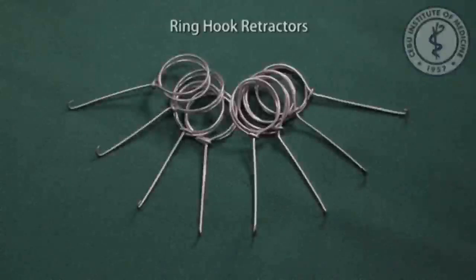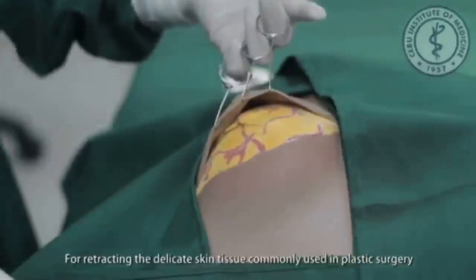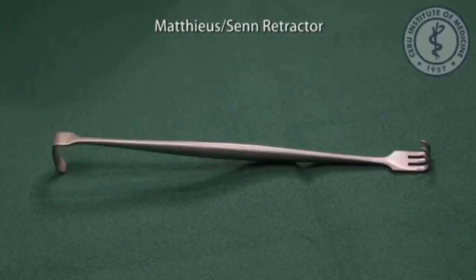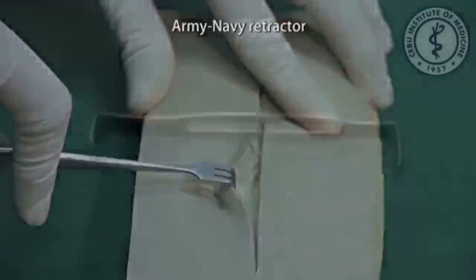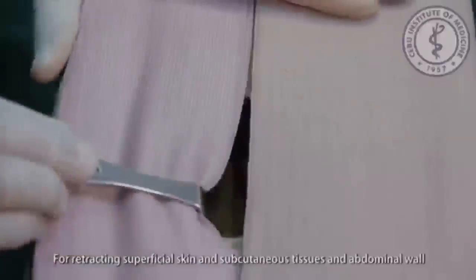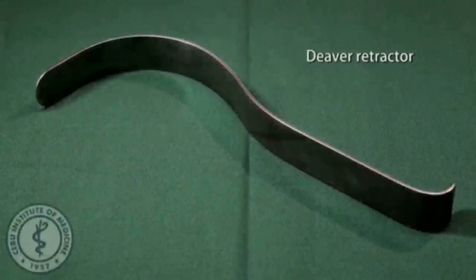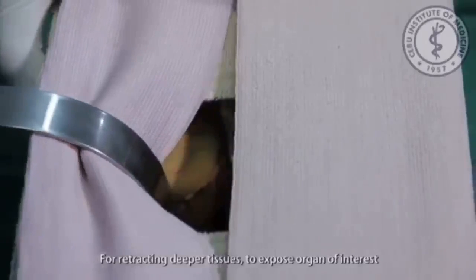Retractors. Ring hook retractors, for retracting delicate skin tissue, commonly used in plastic surgery. Senn retractor, for retracting superficial skin. Army-Navy retractor, for retracting superficial skin, subcutaneous tissues, and abdominal wall. Richardson retractor, for retracting muscle tissue. Deaver retractor, for retracting deeper tissues to expose the organ of interest.